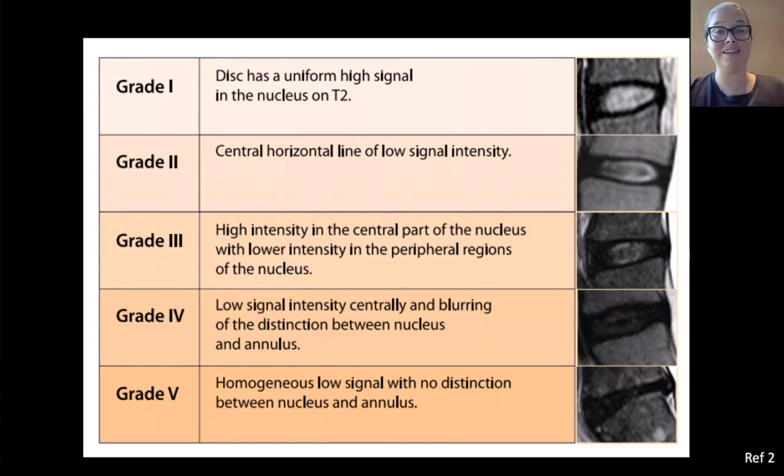There are some grading schemes that, if I'm asked about it, I'll just look it up and give them the grade. I have never seen anybody grade disc desiccation. Usually my description is literally just multi-level loss of disc height with disc desiccation, greatest at L4-5, something like that. But just so you know, there is a grading system.